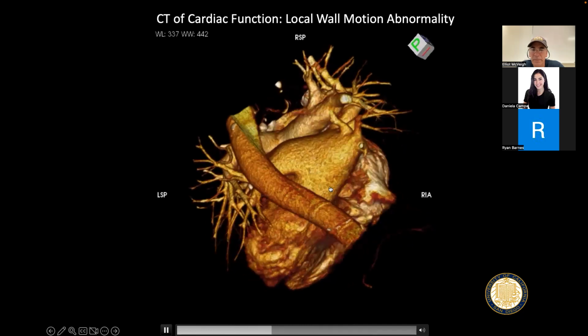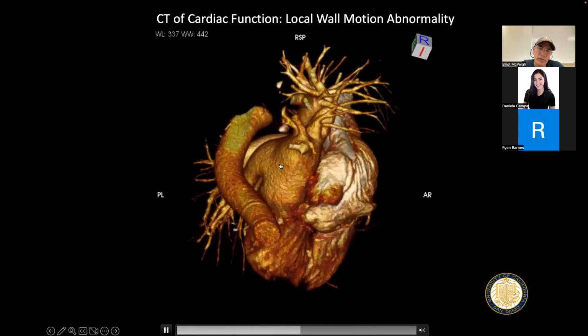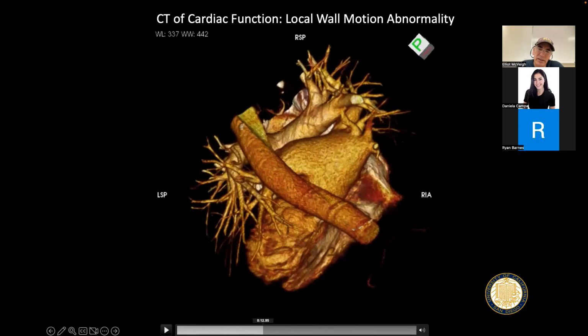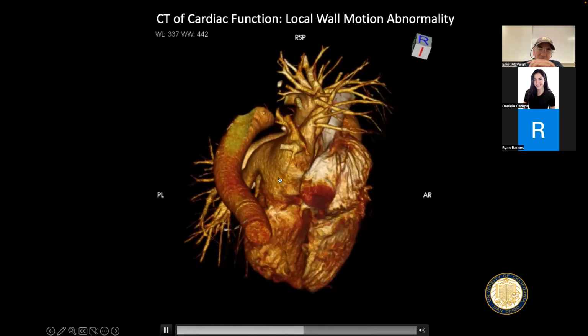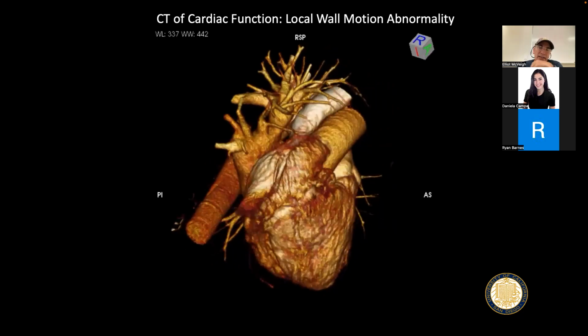So you can see how the posterior wall of the atrium is contracting in here. The roof is moving down on each contraction. See that? You can see the strain that happens to the pulmonary veins, where they're coming in. None of this data is used right now to analyze atrial function.